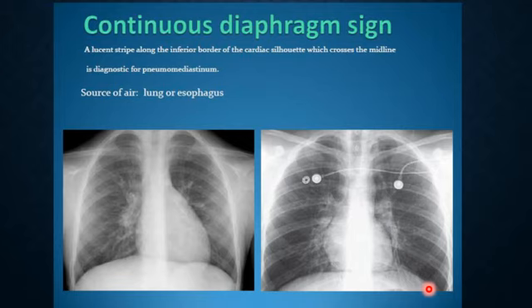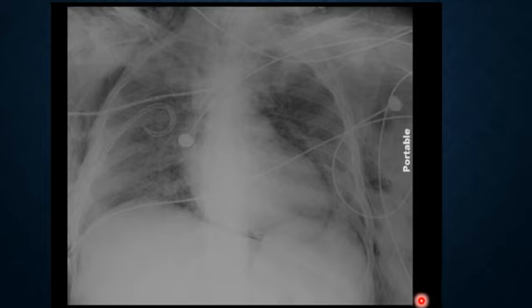Not always. Many of these patients are usually in the ICU, usually intubated with multiple ECG leads, and usually it's a portable chest x-ray. It can happen in otherwise relatively good or healthy patients, but usually it's something like that. Multiple wires, multiple tubes, multiple things, because pneumomediastinum is not something easy to pass, okay? You can see the diaphragm continuous from one side to the other.